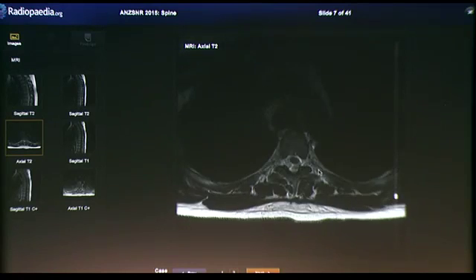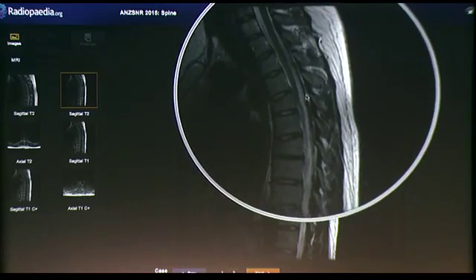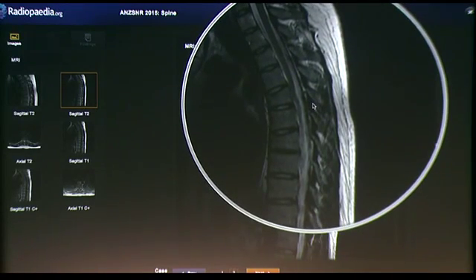So there's a couple of clues. One is the way, so these cord herniations do tend to be a little bit off midline, and so they do tend to have that really distorted and rotated appearance. The kink tends to be quite focal, and it's this nice C shape as opposed to a more gentle curve in some other pathologies I'll go into later. And one of the key findings to help us determine that there's probably not something behind going on is that there'll be no change or alteration focally in the CSF loculi posterior to the cord.